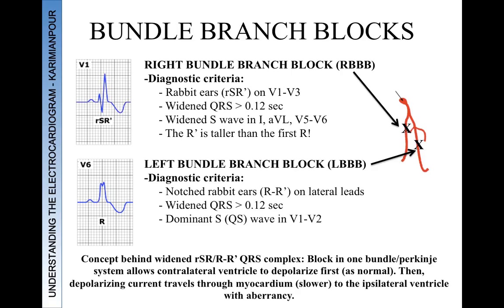There are some other findings which I've listed here as well that help you decipher if this is a right bundle branch block or left bundle branch block, or if there's a left anterior fascicular block, and so on and so forth. So let's go through some of these.